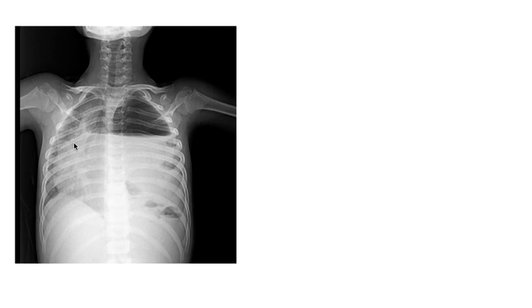Again, what is there in this x-ray? So again, hyperlucency as well as opacity. There is homogeneous opacity, as well as hyperlucency. But what is characteristic is this straight line. This straight line is suggestive of an air fluid level. So if in any cavity there is both air and fluid, you will see these air fluid levels, right?